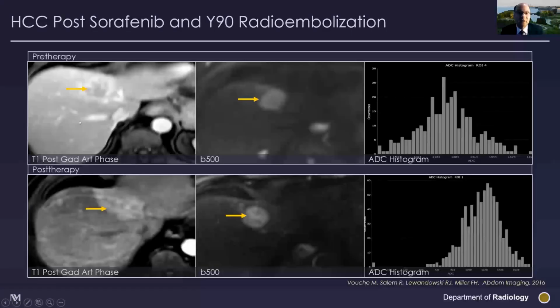We did some study after this because I wanted to look at it as well. And we could see, again, looking at the actual diffusion images, it was hard to assess. You can see that it was adequately targeted. As I mentioned, you can see that area of enhancement. But what's interesting here, and this could be time consuming, so we don't routinely do it, but for this study, we did do it. And you can see there's a shift of a lot of the tumor, the volumetric shift to the right because the ADC values increase because of more free water.